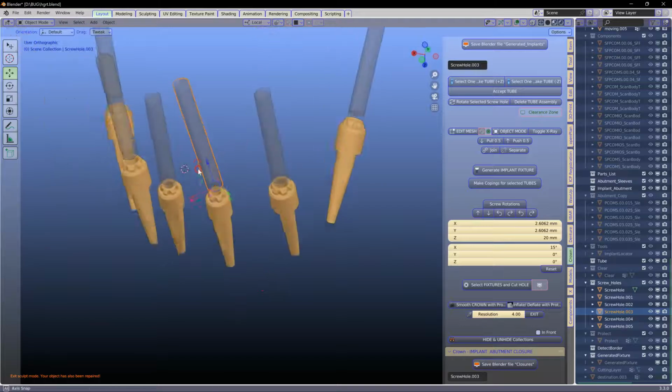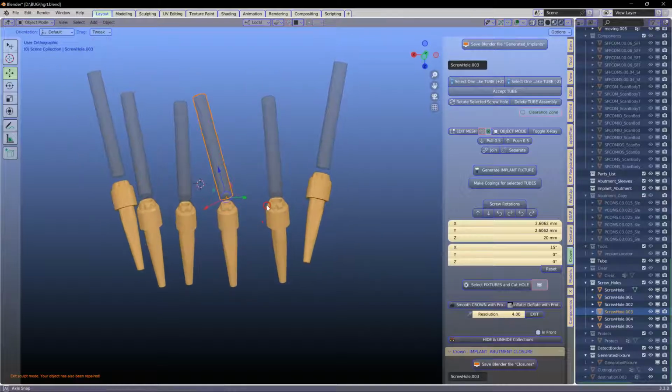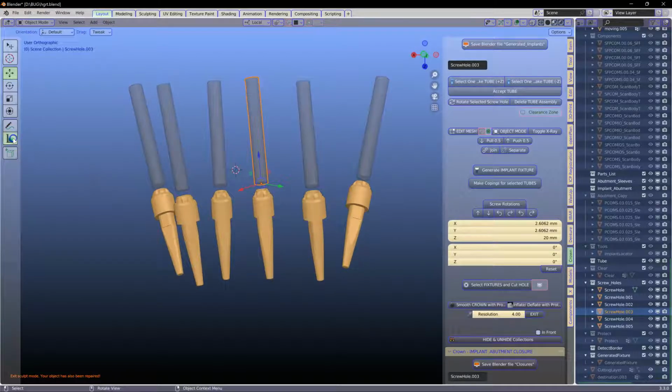But if we don't have that, if we've got a multi-unit abutment which actually turns on the top of the implant head, then that becomes a little bit different, and I'll demonstrate why. I'm going to set this back, and then we're going to briefly create measuring an angle. So let's just go from the top here to the bottom.